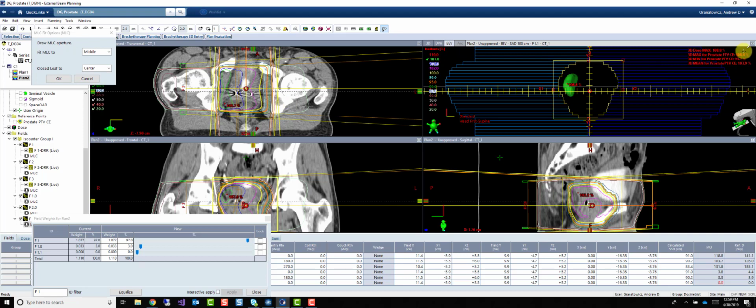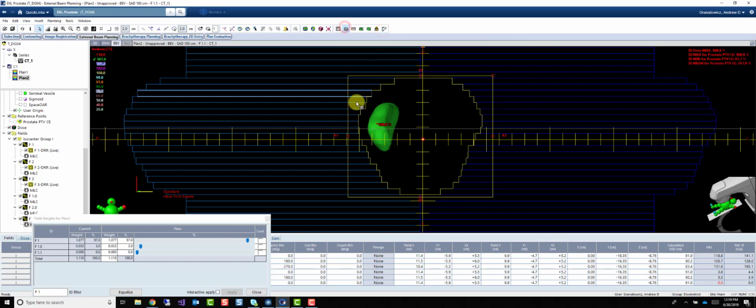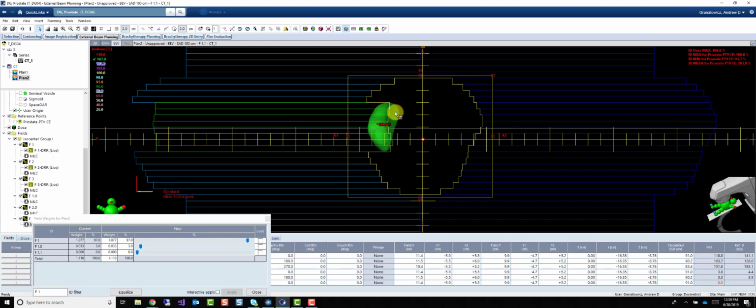So what I'm going to do is I'm only going to bring my MLCs to that first initial shadow, or the edge of the anterior portion of this 107 volume, like that. And then on my AP or my PA field, when we make one next for our F2 beam, I'll be blocking this with that one. So again, it's just a method of really fine-tuning your field and fields and getting a really smooth, really good dose distribution.